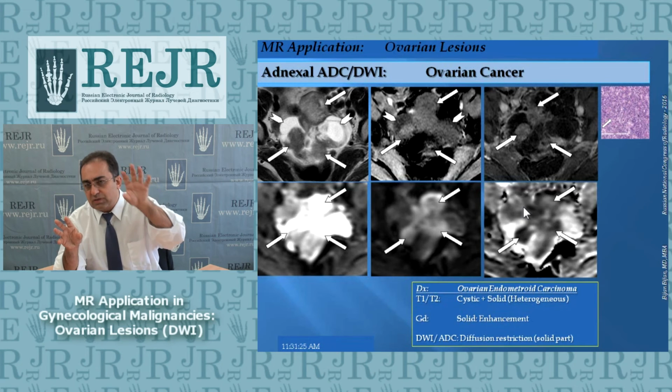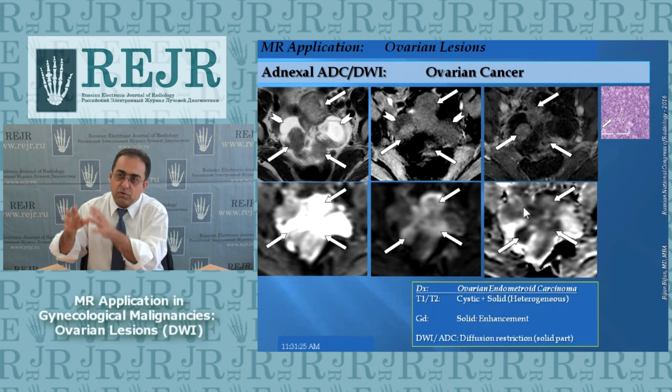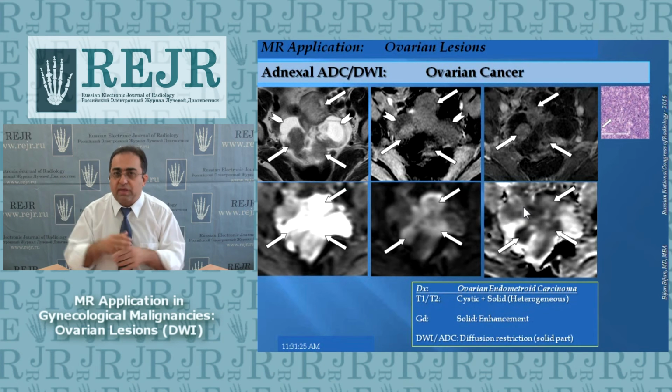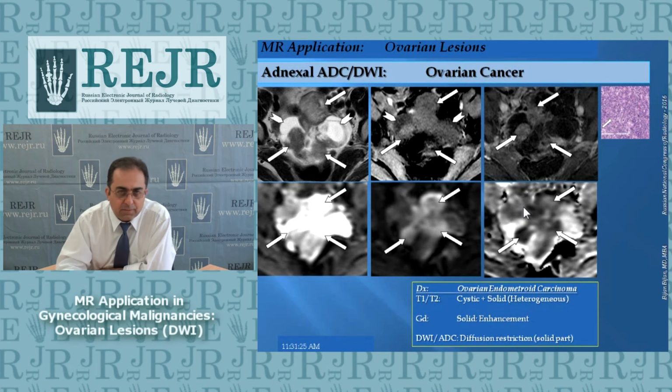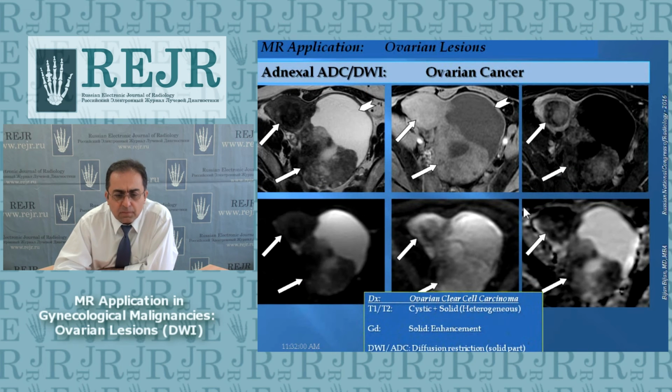So you are treating the most aggressive part, but later on, the less aggressive, well differentiated portion of the tumor can actually grow and take over. That happens, for example, very often in lymphoma, and also can happen in ovarian malignancies if they don't take them out completely. Let's take a look at this one.